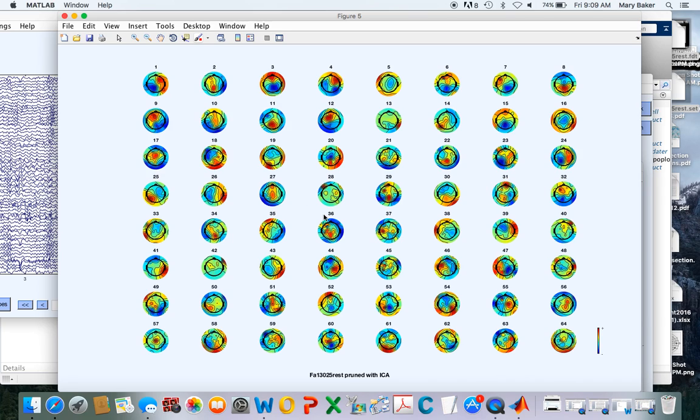It's very spread out. On the other hand, if you look at component 37 and component 36, you see how there appears to be power located strongly in an area within the brain. Component 39 looks more like a movement, because see how it's located out of the brain, although that might also be a hearing kind of thing or a temporal lobe kind of thing. Look here at 61, how all the energy appears to be outside of the back of the head. This is more likely some kind of generic noise. On the other hand, 49, 50, 51, you see how that activity is localized to a brain region.